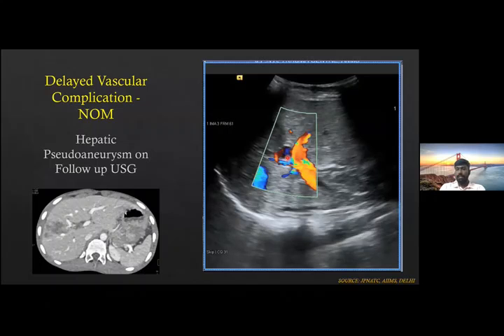Here you can see the yin-yang phenomenon. In this patient who just had a laceration, in the initial CT there was no pseudoaneurysm or active extravasation. However, 10 to 15 days later, the patient presented. We'll see this case in detail later on in the slides.